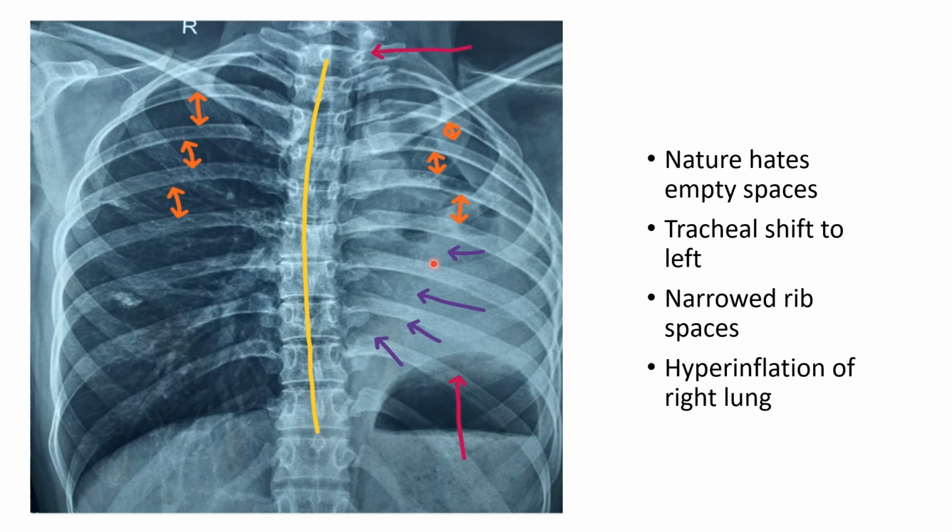So I repeat, first see this X-ray grossly, then you can find that the right lung is larger, and then you find that the left lung is almost absent. Then all the features of volume loss are there. Tracheal shift is there, then mediastinal shift, the heart shadow is shifted, the diaphragm is shifted up, the rib spaces are narrowed, and the opposite lung is hyperinflated, and it also herniates into the left lung. So this is the X-ray for studying volume loss in chest X-ray.